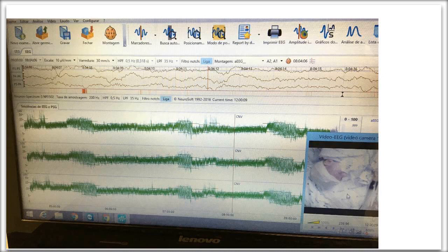But you can certainly see in this EEG that it's quite active. There's a lot of activity. For our babies, we don't always see this much activity. So it does have a lot of background activity, which is causing this narrowing of the aEEG. But I think it is completely normal for age.